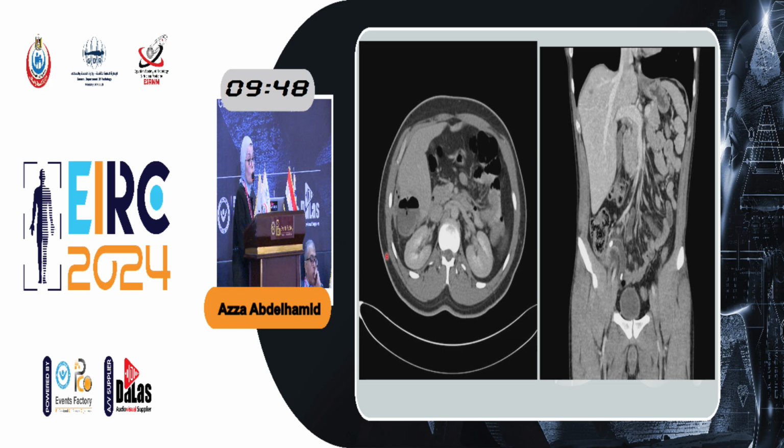Sometimes we go to CT if you have an abnormal location, like in that case, a subhepatic appendicular abscess. With the coronal formats, you can see the appendix, you see the fluid-filled appendix, you see here also surrounding the appendix this dirty fat with fluid surrounding it. I would like to add something here about the technique of CT. You should give oral as well as intravenous contrast to look at the enhancement of the wall and to separate the appendix from the contrast-filled other bowel loops.